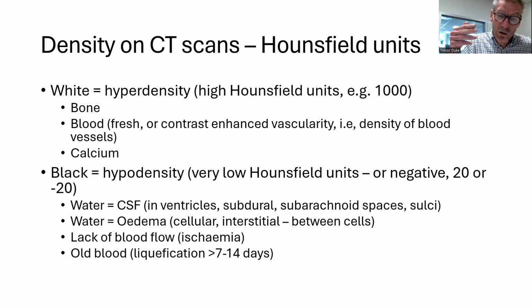And so water, for example, cerebrospinal fluid in the ventricles, or the normal cerebrospinal fluid in the subdural space or the subarachnoid space, or the sulci that are between the convolutions, the gyral pattern of the brain, that's very low density. It has very low Hounsfield units.